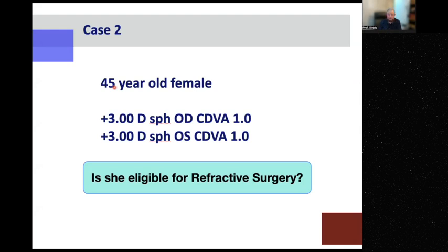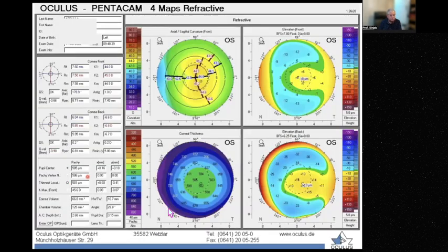Okay, let us see. Now, if we go for very thin flap, 100 micron, the patient is 581 micron. So we have very beautiful thickness. And if we make the cut very superficial, and we know that the plus will not take any tissue from the center, so all of that will be nice and smooth.